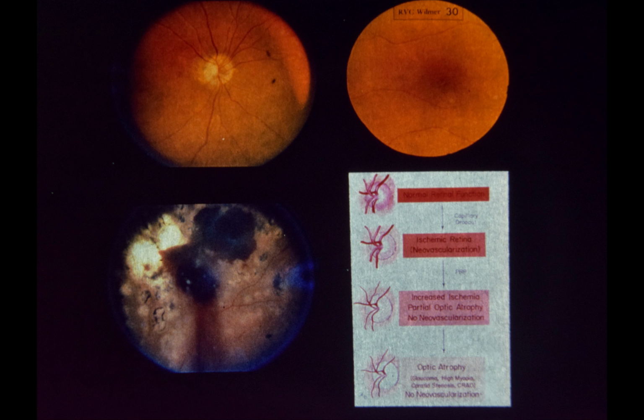Encouraging results from this preliminary study form the basis of using the scatter or pan-retinal photocoagulation technique in the diabetic retinopathy study. Lower right, the artist's sketch illustrates one possible mechanism of how this theory works.